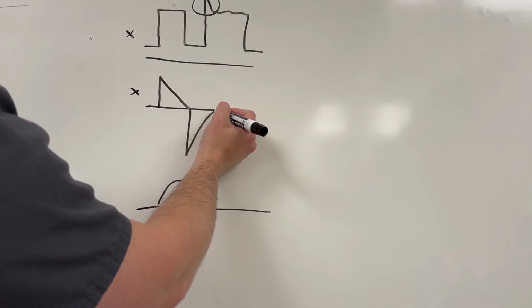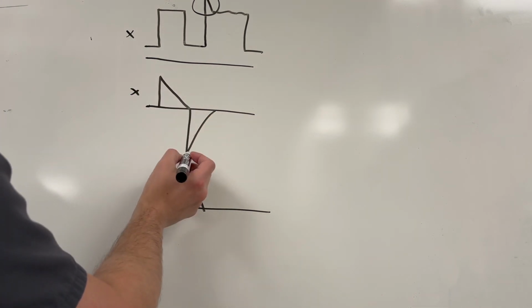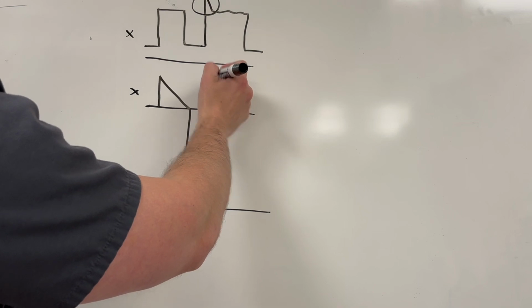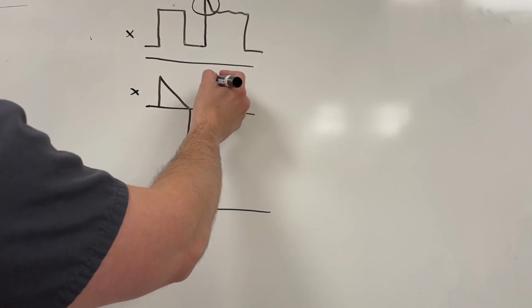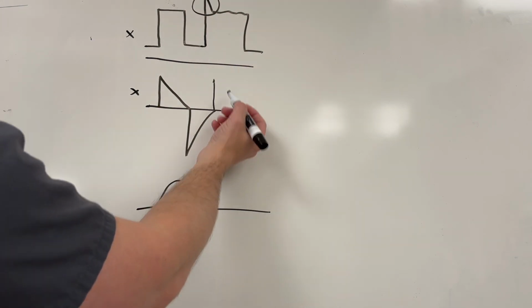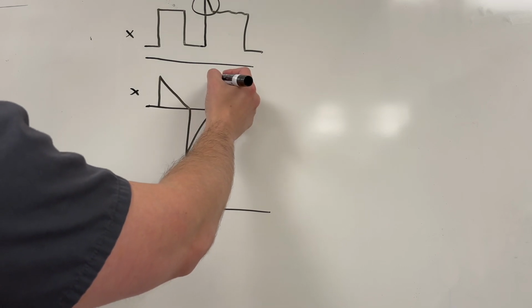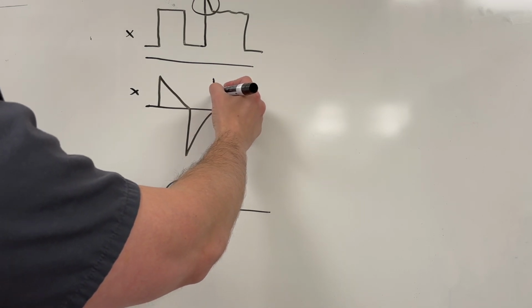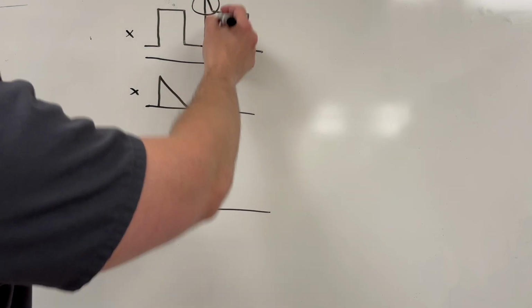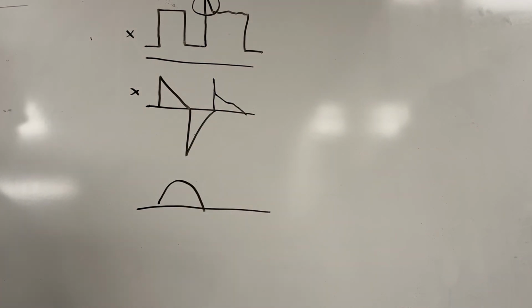On your flow waveform, instead of going up straight and having a smooth deceleration down, we inspire and we overshoot this pressure. Then the flow rate that we're pushing in has to drop so that we come back down to this pressure. So instead of having a smooth deceleration, you're going to see it drop out kind of fast. And then as it resettles, you'll see it get more into a decelerating flow like that.